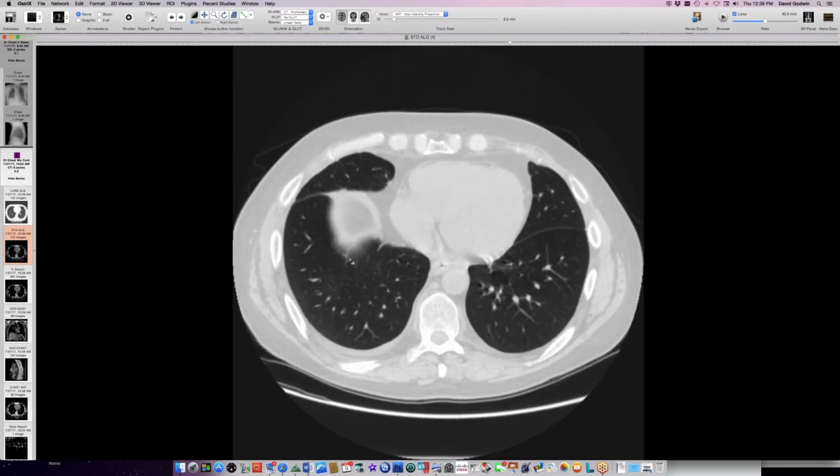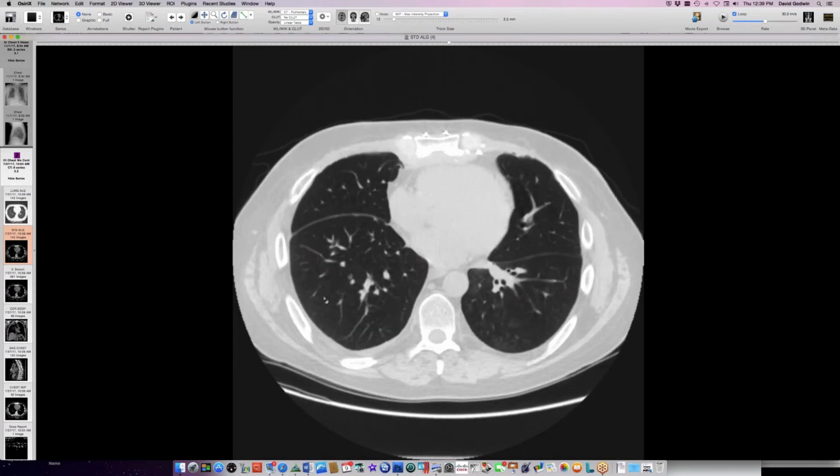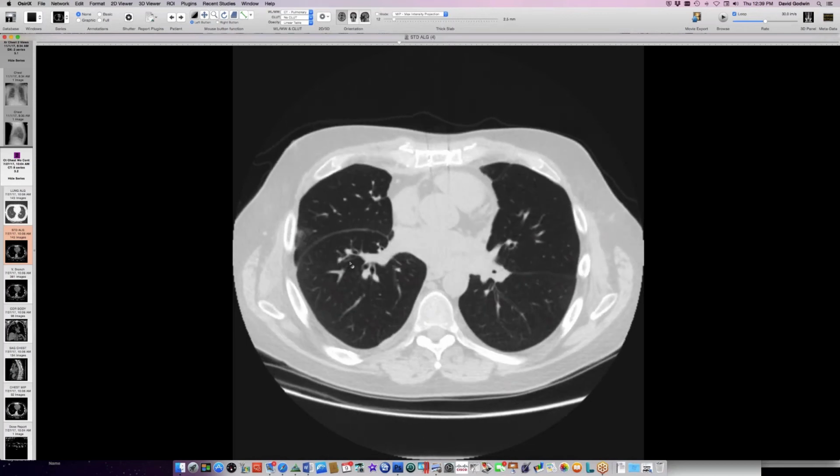How about just motion and breathing, making the wire just traverse the mediastinal fat into the lung rather than getting there via the bloodstream? Is that possible? Just a sharp thing? Yeah, it seems awfully remote for that. Well, you can trace it from a vessel, can't you? Right.